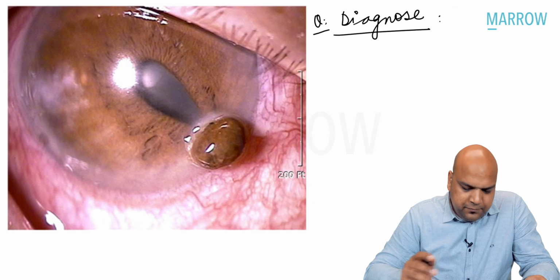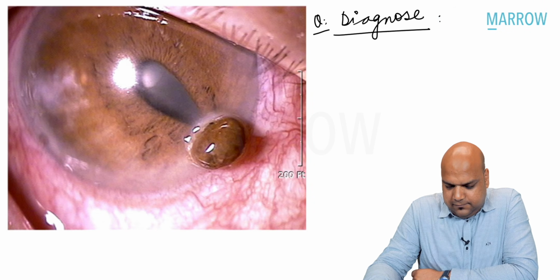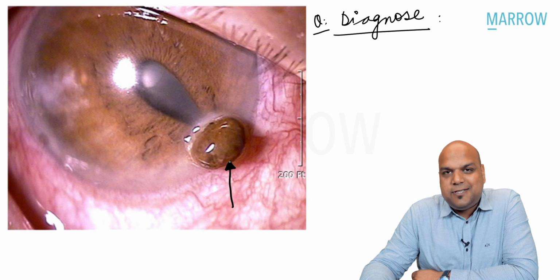Basic, right? Moving on. Okay, an interesting image. What do we see in this image? Is this an iron foreign body? Is this a chisel and hammer injury, like we did, I think, 3 or 4 questions back?